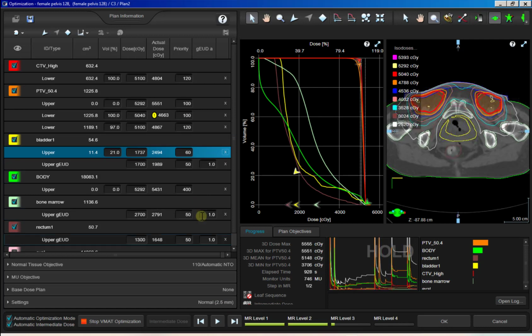All right, so pretend we adjusted those, everything's happy in level 3. Now we're just letting it play through, pausing at all those spikes. So I'm going to fast forward through this until we calculate final dose here.